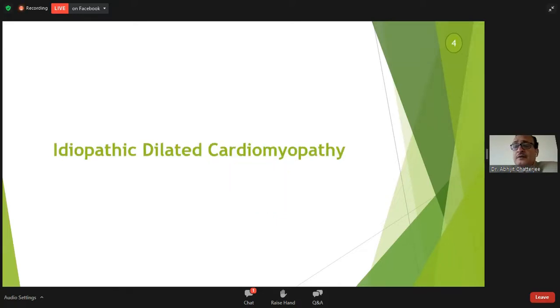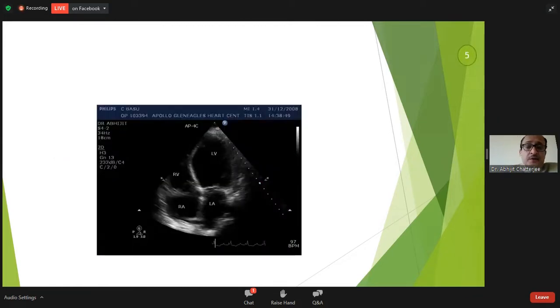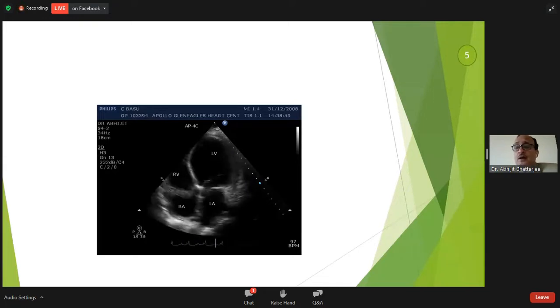Let us have some pictures of idiopathic dilated cardiomyopathy. This is ischemic dilated cardiomyopathy. This is a patient who had old myocardial infarction and who's got a septum and anterior wall which are thinned, scarred, and akinetic. The left ventricle and right ventricle are both enlarged, and the systolic function is very poor. There is also a jerky movement of the interventricular septum.